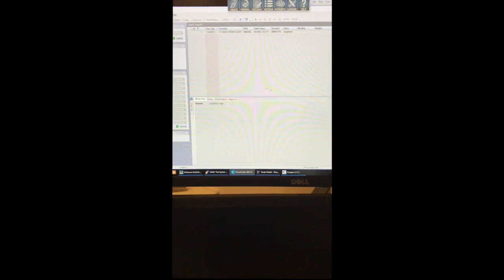Then you get to the findings section, blah blah blah, and it doesn't like that. Okay, and massive subarachnoid hemorrhage. Then you sign the report and you're done. So that's how we could survive on February 5th if you don't know a single thing about rScriptor. But let's go back, and I don't want to save that, and I'll do a standard rScriptor report again.